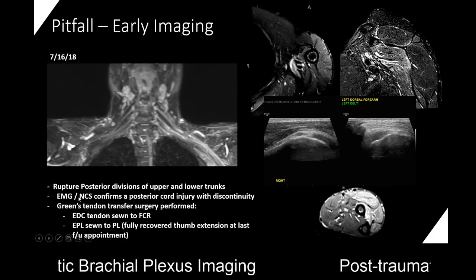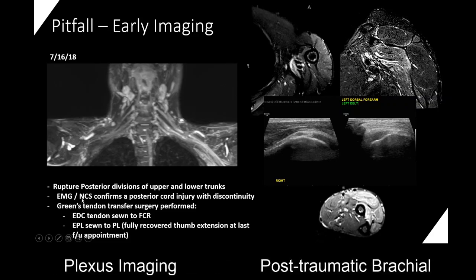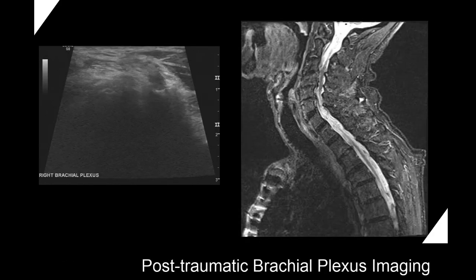An electrodiagnostic study was performed which confirmed a posterior cord injury with nerve discontinuity, and the patient ended up having tendon transfer surgeries to try to fix some of these problems.